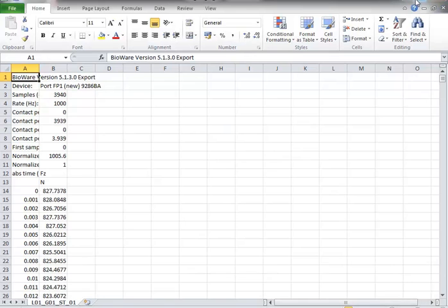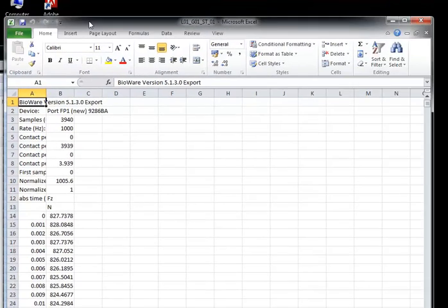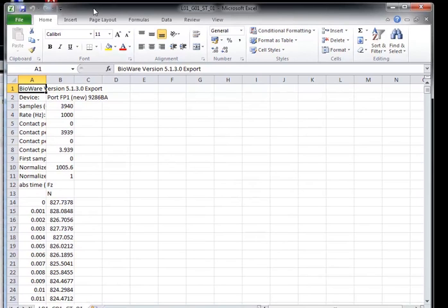We need to have a bit of a look at what we've actually got to deal with. Now, you can see the name of the file, L01, G01, ST01. Well, that means lab 1, group 1 within that lab, and it's the height of the sternum and number 1 lift. If you just look at the top, the file name will be there. So we've got this force data. Well, we've been kind to you.